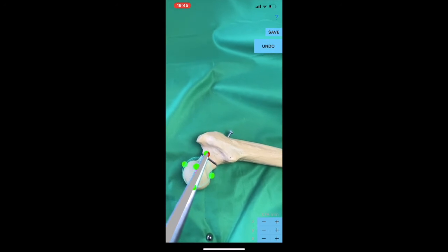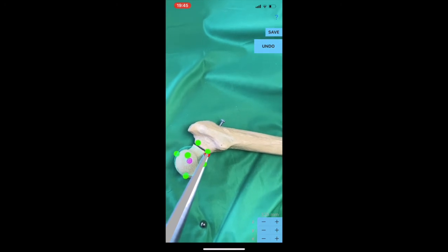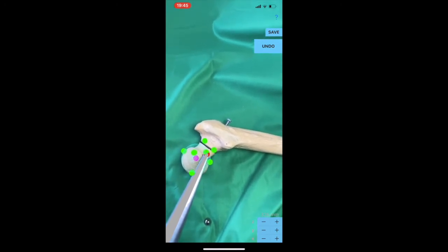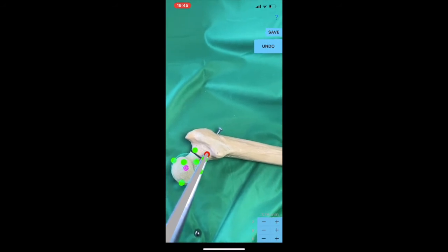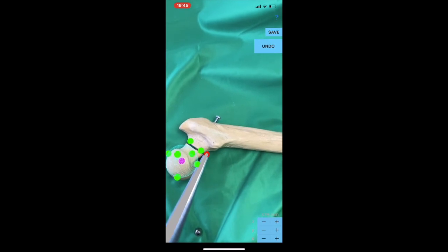In the same manner, aiming preferably at the marginal circumference of the femur neck, at the most distant parts of the neck, 4 points, N5, N6, N7, N8, are selected and registered by pressing the screen each time. A yellow cylinder appears overlaying the real femur neck.